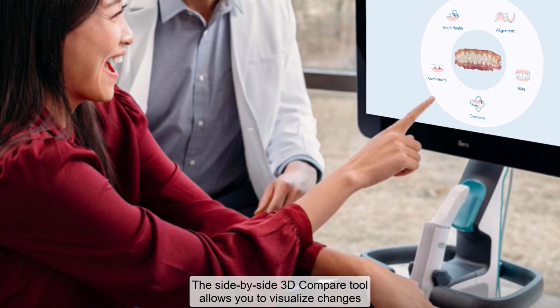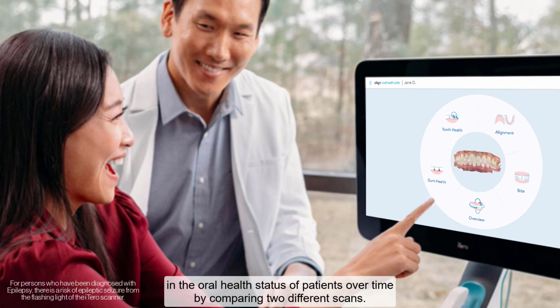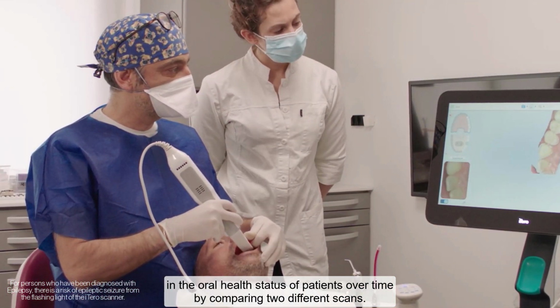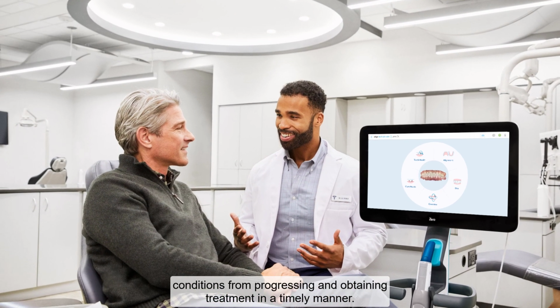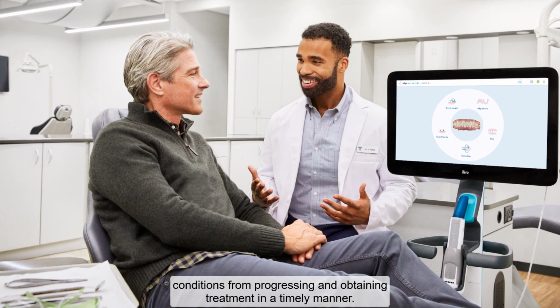The iTero Side-by-Side 3D Compare Tool allows you to visualize changes in the oral health status of patients over time by comparing 2 different scans. This visualization helps patients understand the importance of preventing conditions from progressing and obtaining treatment in a timely manner.